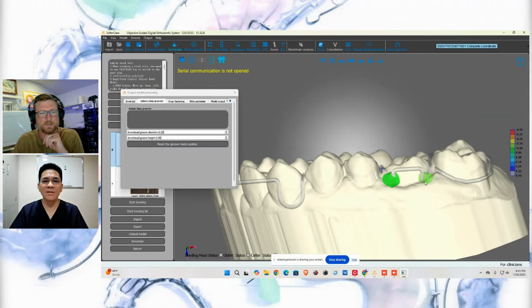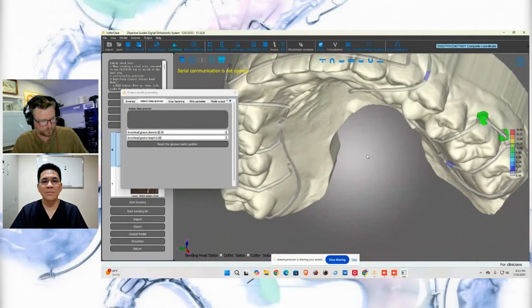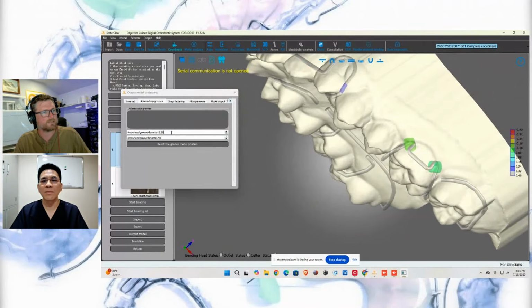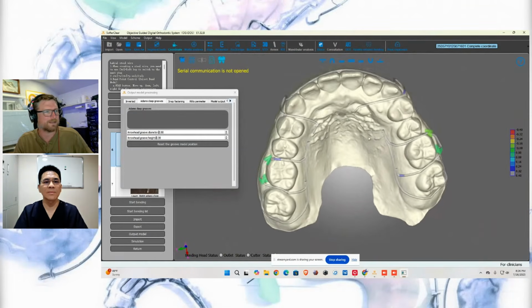Yeah, this one I put into the gums, so I can change that also. Now, another trick that you taught me was that if I shift click, I can change all of them at once. See, they're both changing, and you can see the depth of that cylinder is changing. So I'm going to leave that over exaggerated there.